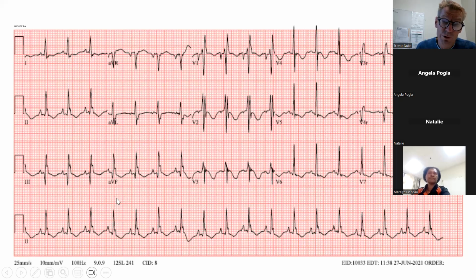And you can tell whether there's a left or a right bundle branch block by looking at lead V2. So V2 has this RSR pattern, whereas lead V5 is just a normal QRS complex, isn't it? Just normal. So this child's got a right bundle branch block because there's a prolonged QRS complex, and because of the RSR pattern, this R wave, deep S wave, R wave again.